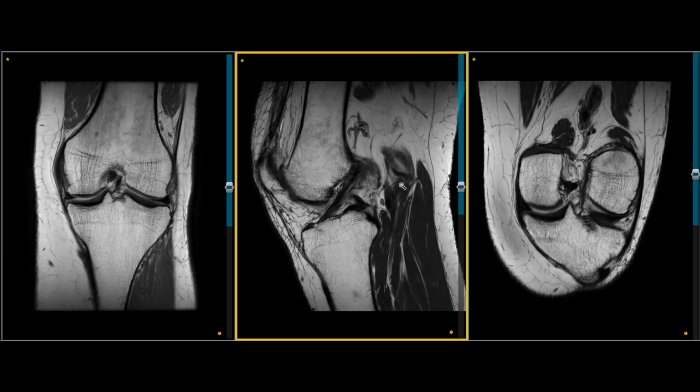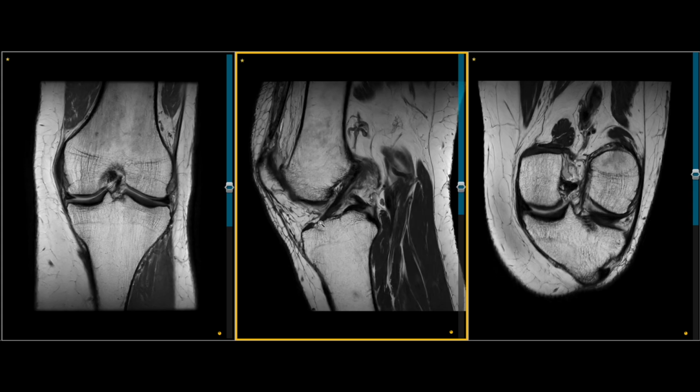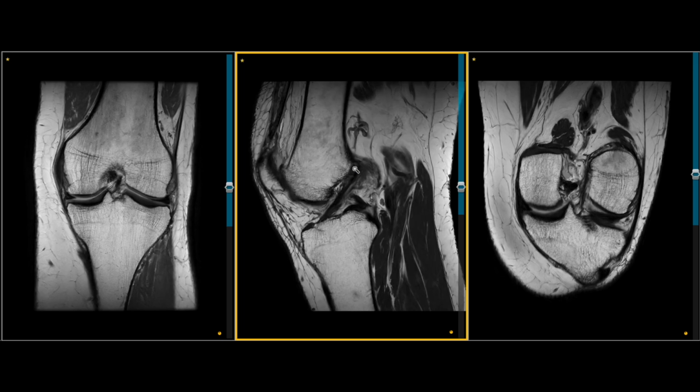and you get that appearance here on the sagittal sequences too, where there is what's perceived to be normal thickness of the ACL in the lower half of the ACL with thin ACL closer to the femoral footprint of the ACL. The trajectory of the ACL still is taut, which is why it is a reduced thickness taut ACL.